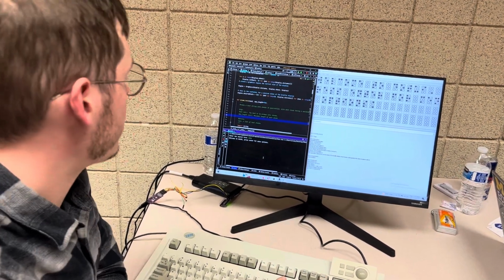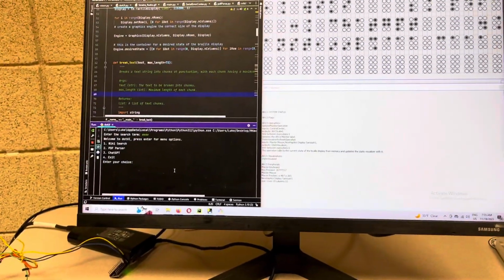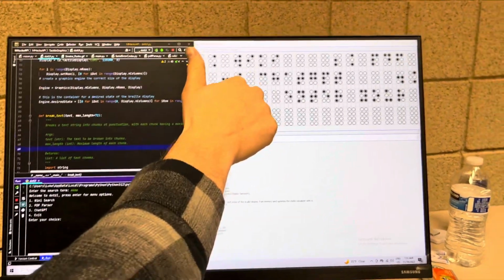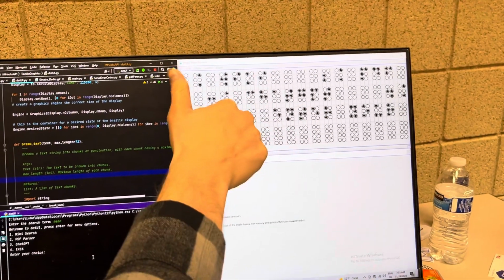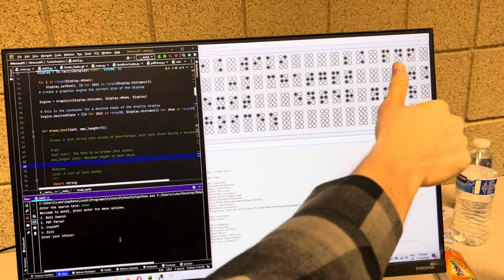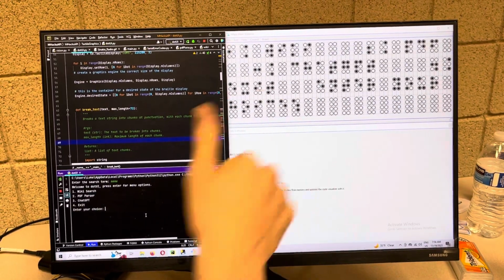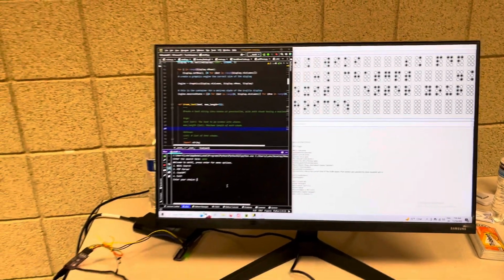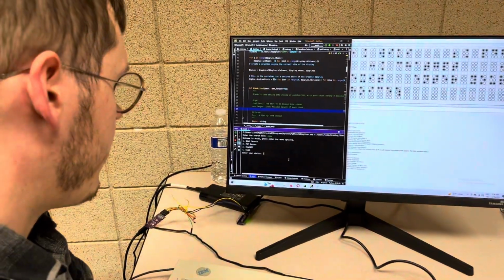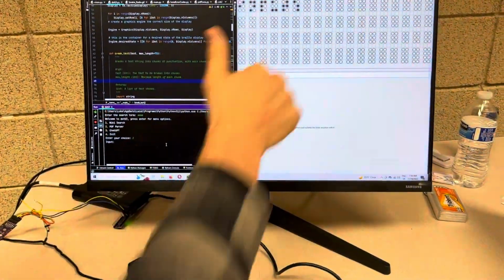So if we press enter, we're going to move into the DotUI API. Imagine this as physical braille cells. They would be reading this with their fingers, and it is giving them a menu of options for what they want to select. First, we're going to use interaction with ChatGPT. So we're going to input 3 into the terminal, and now it's asking for an input.